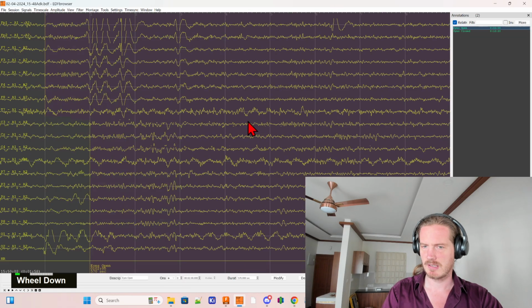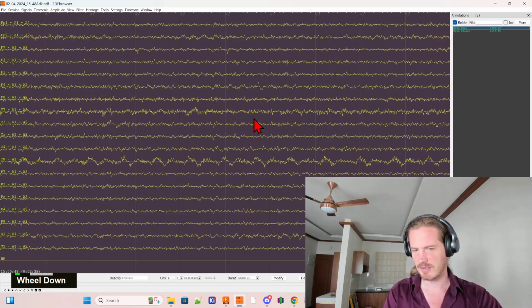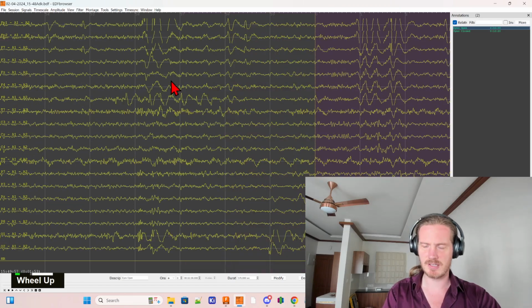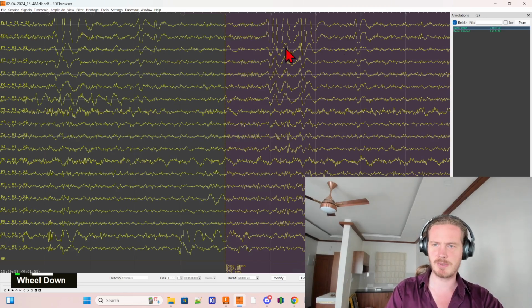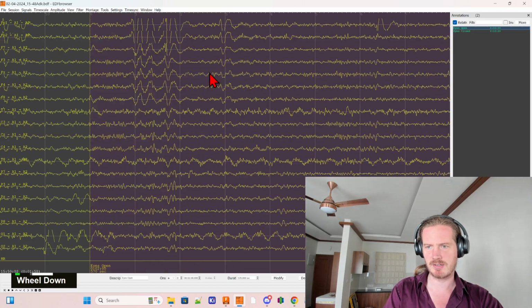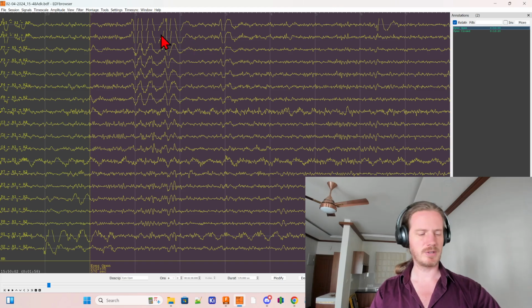And I'm just going to click to the beginning of it. Let's go back to this. Obviously over here there's already eye blinks, but this period here, anything which is not inside of the annotated period within the different tasks will not be processed anyway. At least that's how I have it set up. So I'm going to only annotate within my periods.